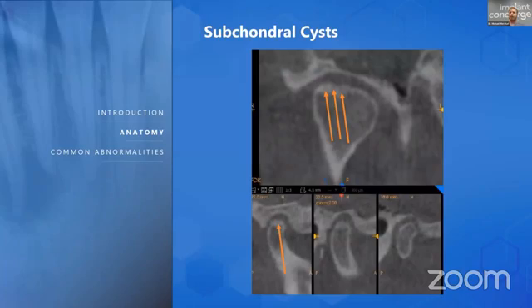And so what's going to happen is the bone around it will start breaking down. And that's why you have these low densities. Now, they're not real cysts, they're basically just gaps of the condylar head. But as you can see here, this patient has sclerosis, and those subchondral cysts will start degrading, and then you're going to have loss of volume or height of the condylar head.